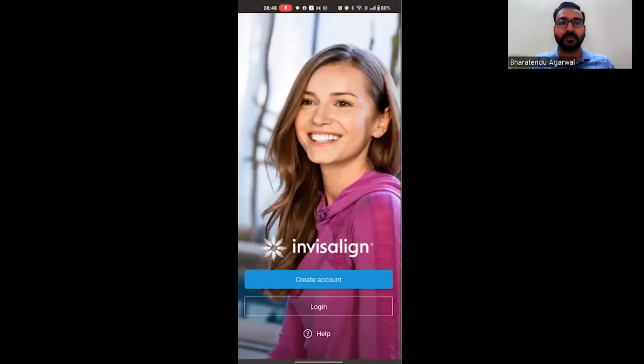Hi guys, today we are going to check out the My Invisalign app. This app is going to be our partner throughout our Invisalign journey. So let's see what the app has to offer.